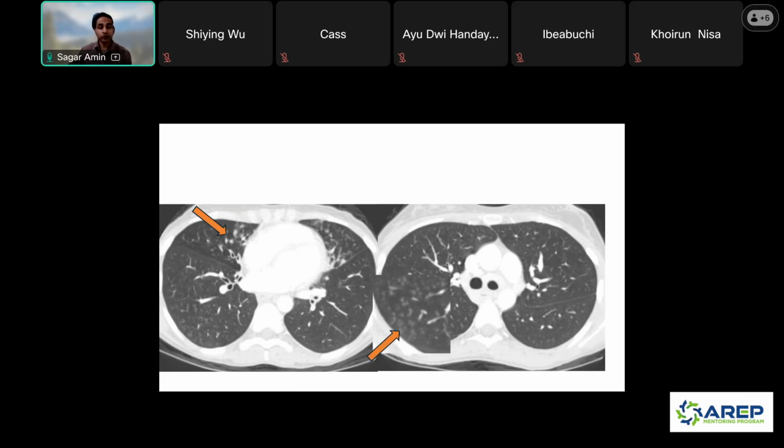So it could be from an infection, it could be from some sort of inflammatory, non-infectious cause. But when we have a patient, and if I had said this was a 70-year-old female, an older patient with more of these abnormalities in the mid lungs, especially anteriorly in the right middle lobe and the lingula, and say if there was bronchiectasis involved with it, then I'd be thinking it'd be a chronic airway inflammatory process from an infection, usually described as MAI or MAC infections.